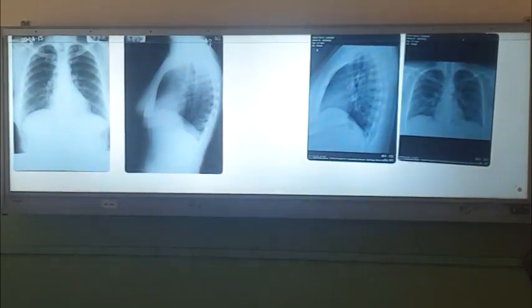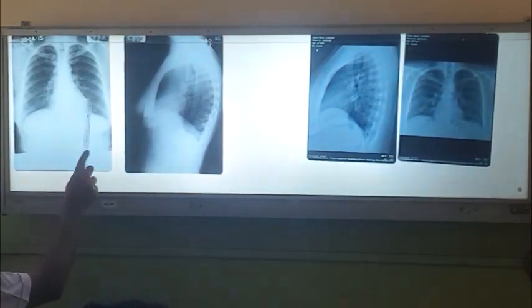And then this is the left ventricle. Next to that there is air in the lingular lobe. So if the lingular lobe is involved, this line will disappear. If there is an opacity here and an intact left ventricular margin, that means the lingular lobe is intact, and the opacity behind the heart is in the lower lobe, right? So this is how you assess.